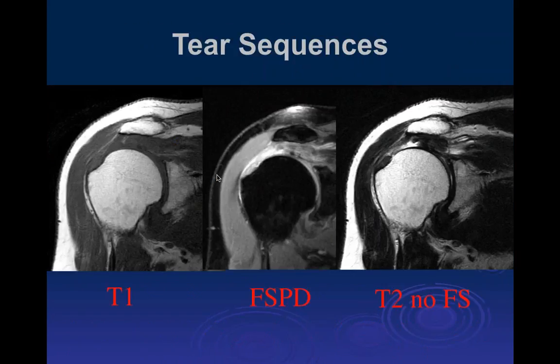Here, when it comes to sections, the coronal plane is one of the best planes to look at the disease of the supraspinatus tendon. But in locations, we also need to look at the sagittal images to determine the anterior-posterior component. So you really need to use both. The axial images are not great for this. They're better for the subscap, as you all know.